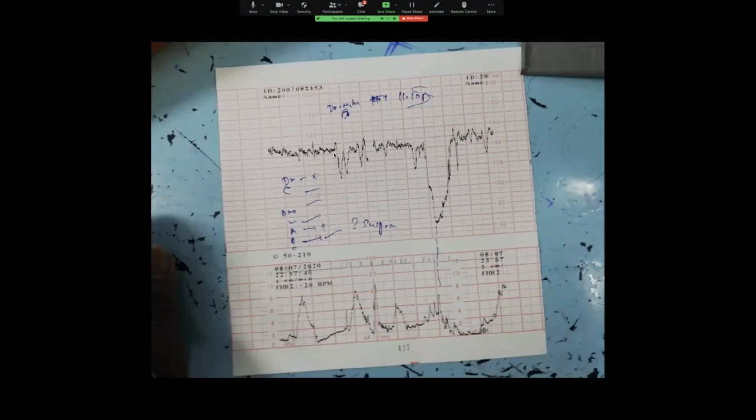Okay, then the baseline variability. So the most amount of variability seems to be here or here. So we will choose 1 centimeter, that is 2 squares, right? From here to here. So the highest point here is this, the lowest point seems to be here. So each square is 10. So about 10, about 20. So the baseline variability is 20. Is that reassuring? Please talk, because I can't see y'all. Yes, sir, yes, it's reassuring. Okay, it is reassuring. So 2 of the features are reassuring.